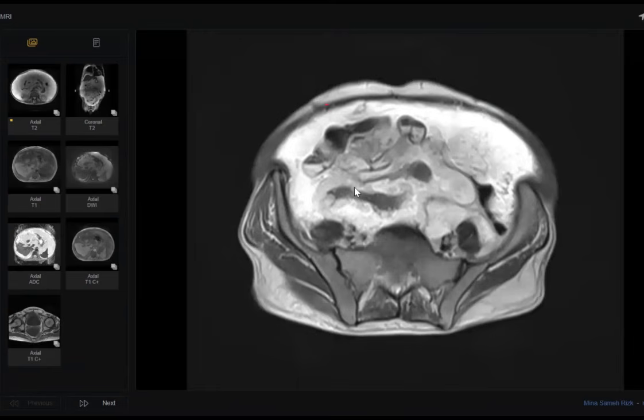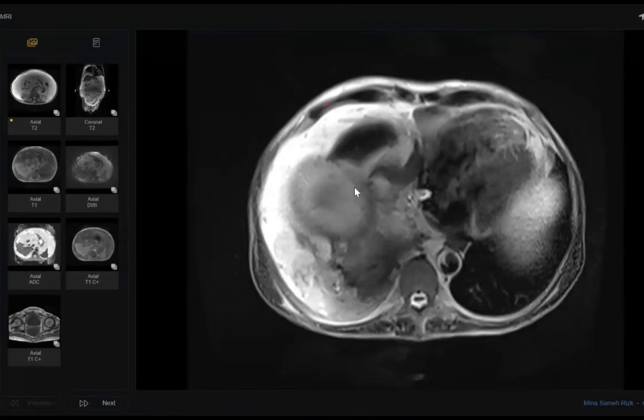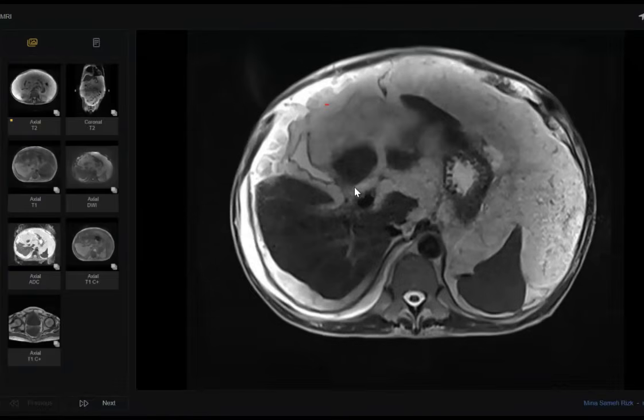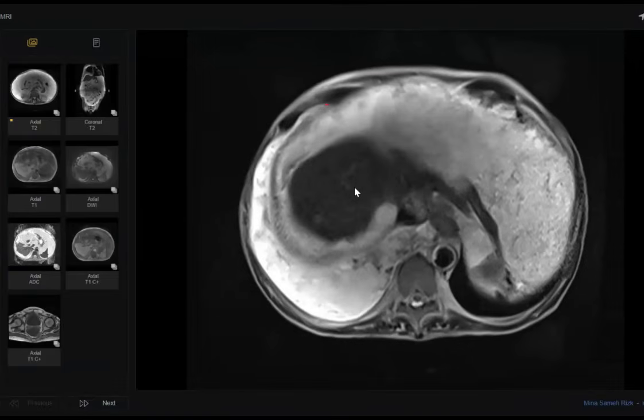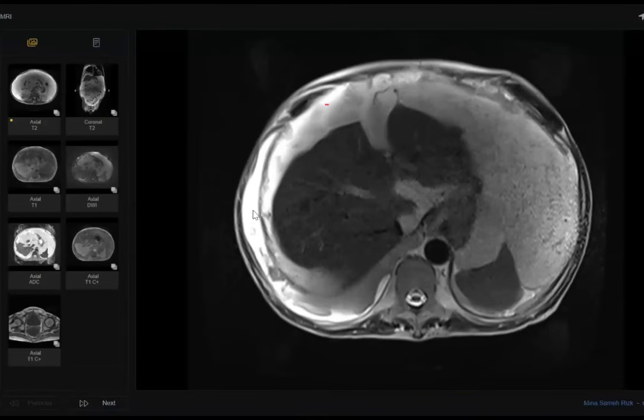Thank you, Dr. Amida, so much. Take care, my colleague. This is pseudomyxoma peritonei. Why? There is extensive high signal ascites, but on T2 not completely. This is the CSF-like fluid, but here you feel it is not the same signal. It is less than this one, so you feel that there is some protein here.